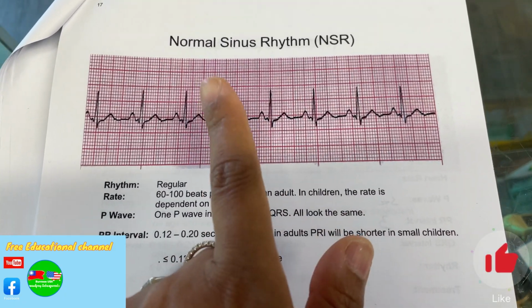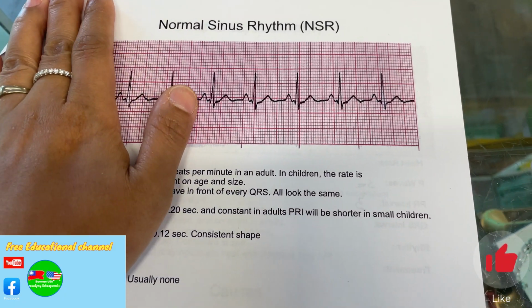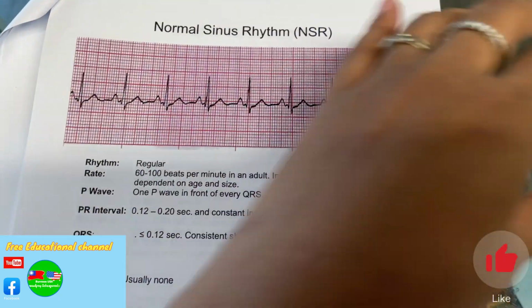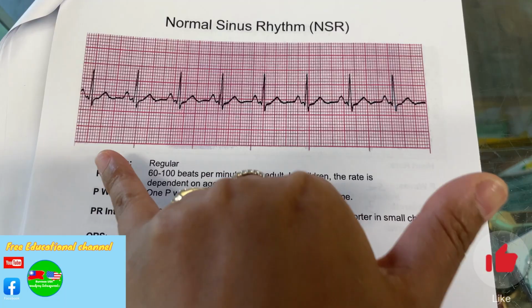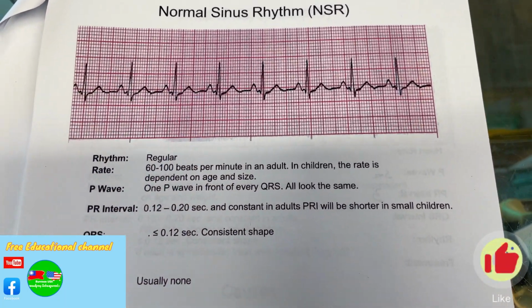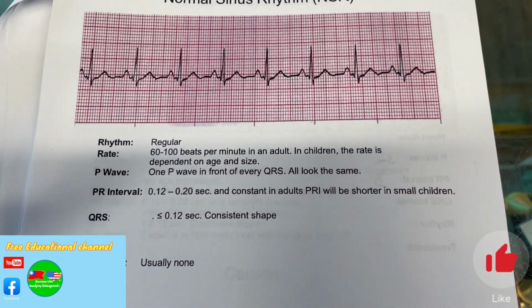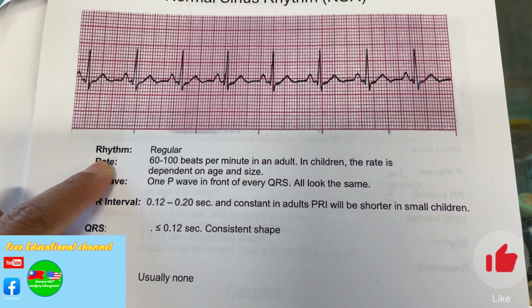That's very important, because in the clinical setting, in the real world, you might see a longer strip, but you're not going to count the whole strip. You're only counting for the 6-second strips. Okay, because I have done that and surprised myself, and then I realized it's only counting for 6 seconds. Anyway, first you look at the rhythm.